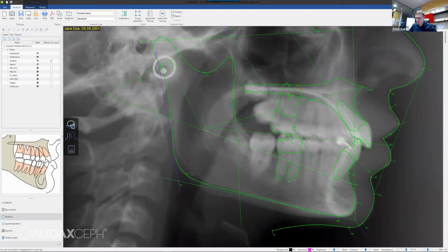This was used in superimpositions because from time to time you could not see the teeth and you wanted to have the same size of teeth in superimpositions. But we added a functionality that all the teeth, in all analyses, can automatically match the initial analysis size of the teeth. So this is not necessary anymore, but of course you can set the size of a tooth inside the first analysis. So at the first stage, or whichever is first placed inside superimposition, and the others will adapt automatically.